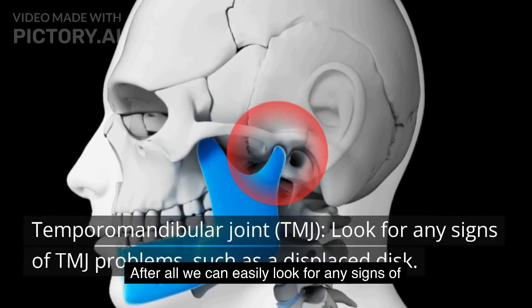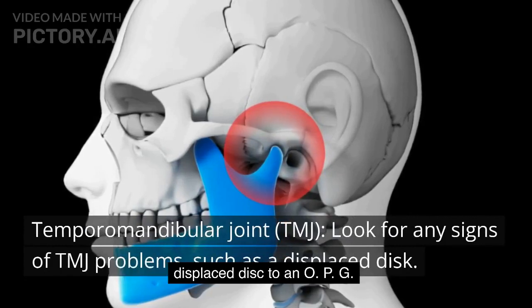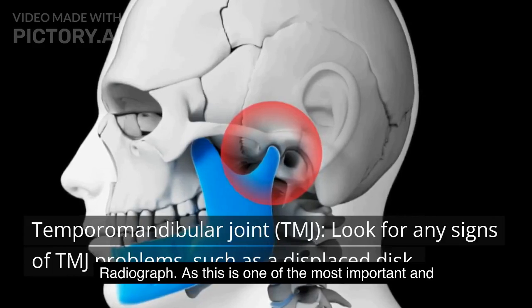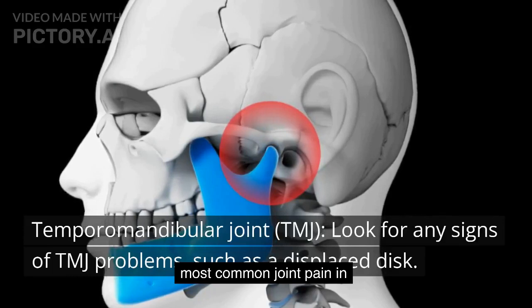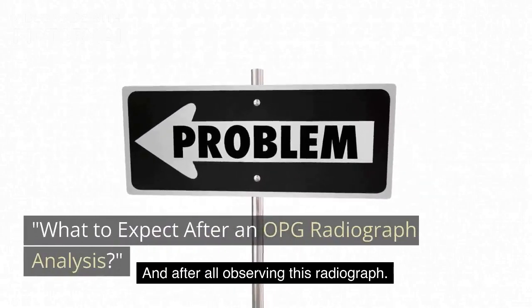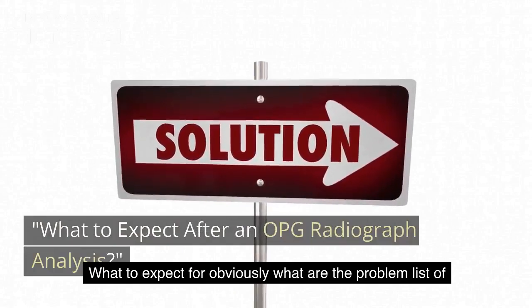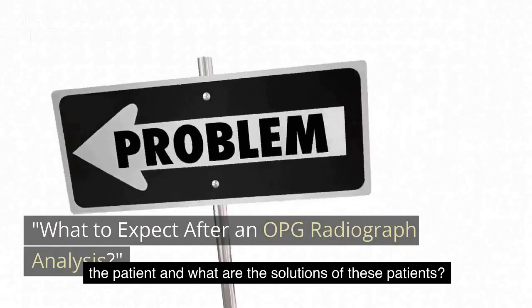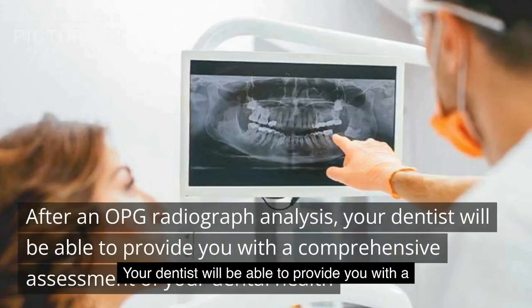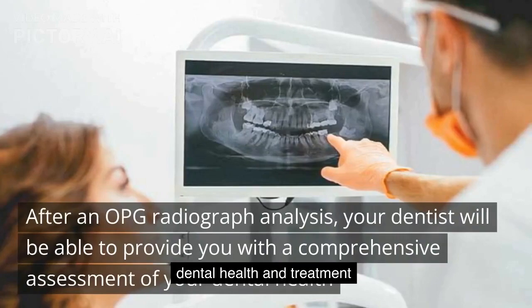After all, we can easily look for any signs of temporomandibular joint TMJ problems such as a displaced disc through an OPG radiograph, as this is one of the most common joint pains worldwide after headache and backache. And after all, observing this radiograph, what to expect? Obviously, what is the problem list of the patient and what are the solutions for this patient? After full OPG radiograph analysis and observation, your dentist will be able to provide you with a comprehensive assessment of your dental health and treatment.